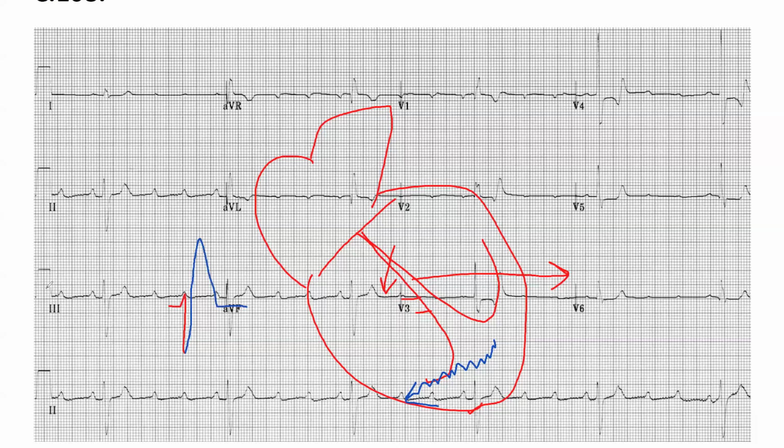On the other side, if you're looking at the left side, the first one is completely okay. The next one, the left ventricle activation, is okay. But here you have a little bit wider S wave. This is why it's a right bundle branch block. The left bundle branch block is a different one. I'll show you that one as well, so everybody should watch now.